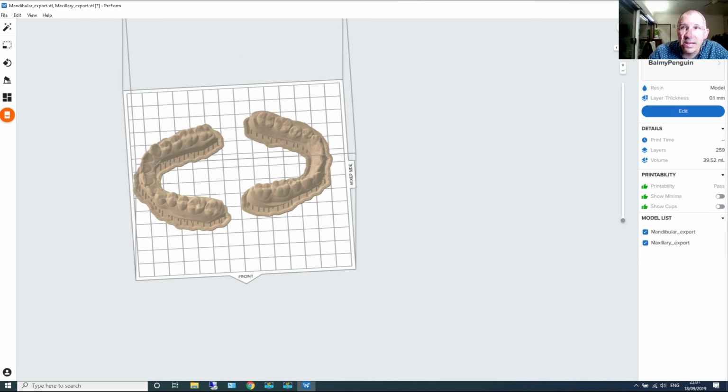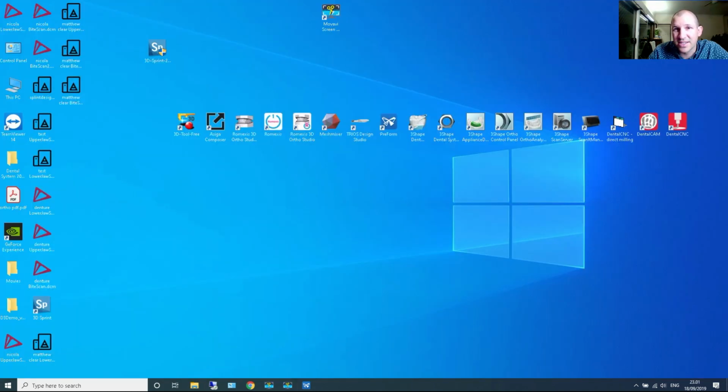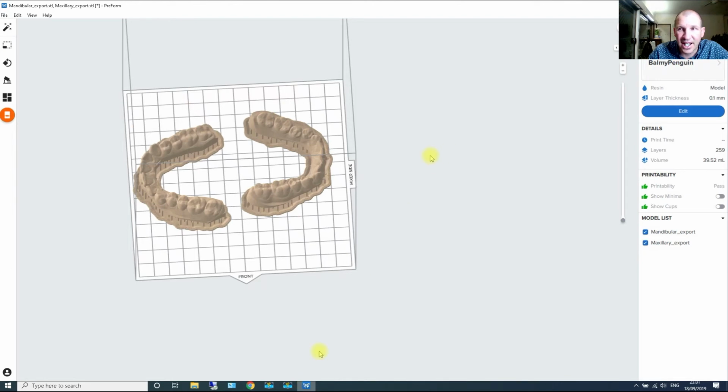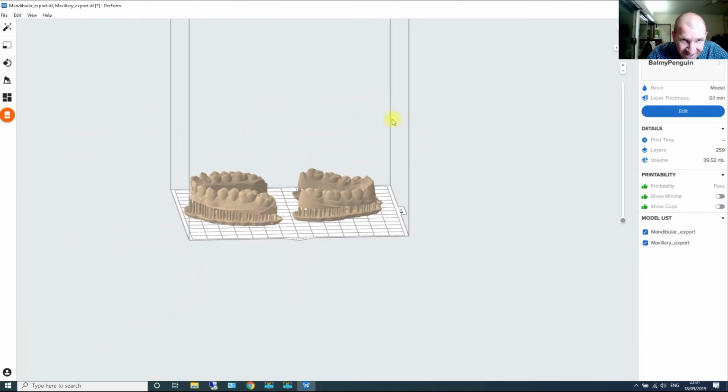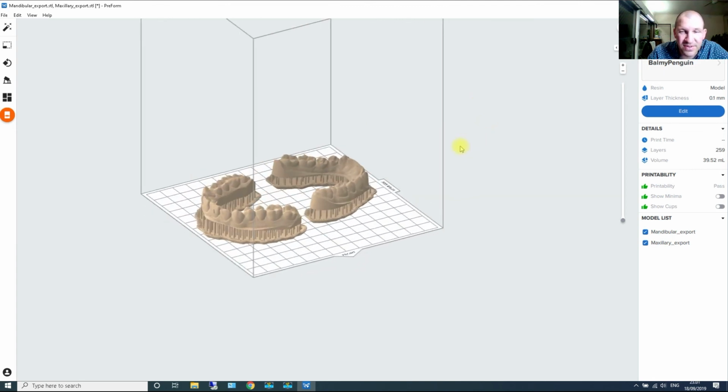So that is my demo for tonight. Sorry the printer side didn't go quite the way I wanted it to. It is late, and obviously without having a printer at home, it makes it a little bit harder to finish off this final part. But that gives you the gist.